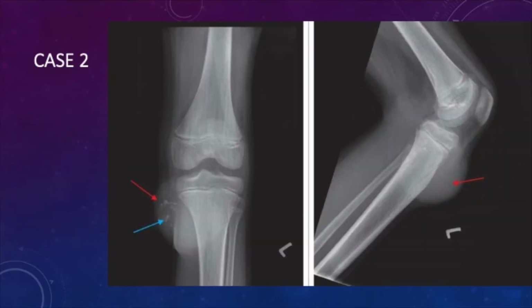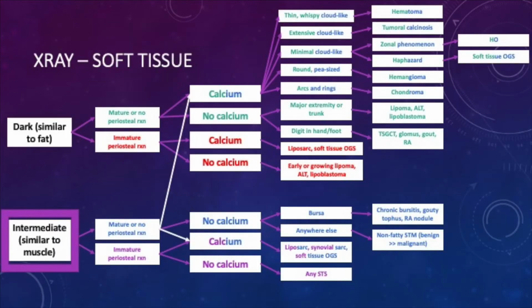When you look at the quality of this lesion, irrespective of those calcium beads that are within the lesion, we can say, looking up at the thigh there, you can see what the intermediate gray of the musculature looks like compared to the subcutaneous fat, and I would say this looks more like the musculature than the fat. So we've got an intermediate signal similar to muscle.